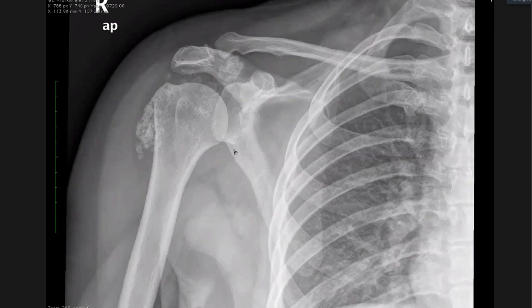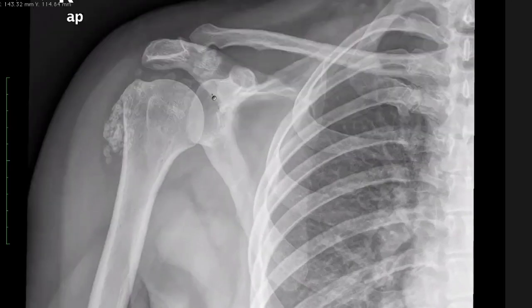Okay. For the time being, if I take all these calcified bodies out, if you look at this shoulder X-ray, would you say it's normal or not? It's a leading question. It appears to be normal. Yeah. So when you see the joint to be normal, like you said, there are no degenerative changes in the joint, right? So these bodies are primarily, synovial osteochondromatosis is a synovial metaplastic disorder, isn't it? So that's primary. Okay, let me show you the MR.